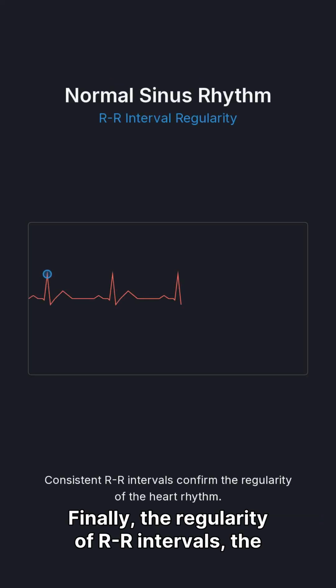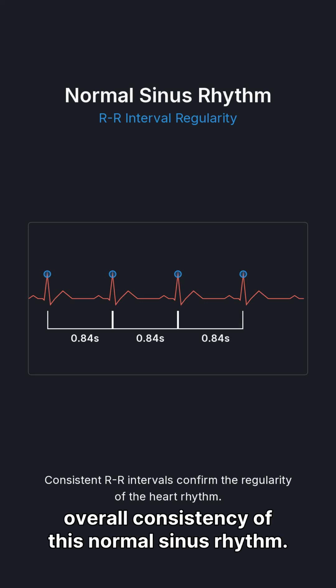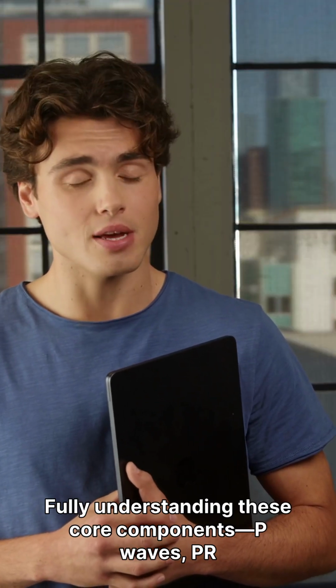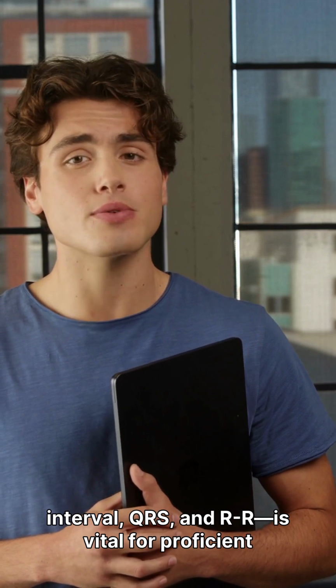Finally, the regularity of RR intervals, the time between consecutive R waves, confirms the overall consistency of this normal sinus rhythm. Fully understanding these core components, P waves, PR interval, QRS, and RR, is vital for proficient rhythm analysis in clinical settings.